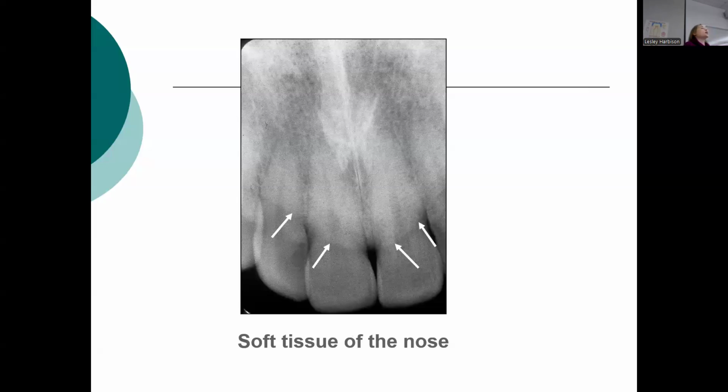There is a question on the test. Yeah, the lip and the nose are up for grabs, as they can be something that can be on the exam. And so that's why I just really say, look at the stack. If it's higher up, just guess nose. If it's real low, like over the crowns of the teeth, guess lips. And I mean, every year people usually do just fine on that question.